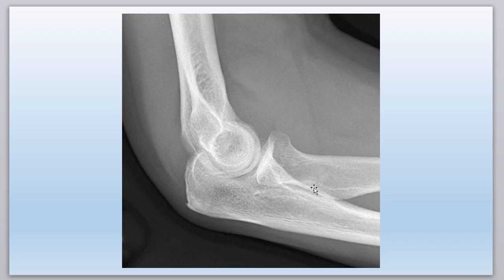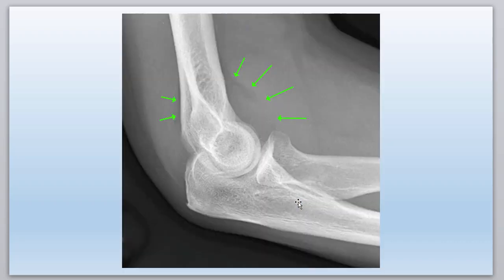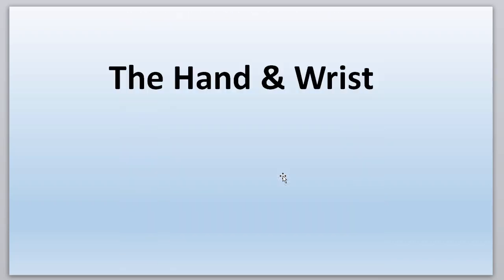They must have had some type of trauma. But my guess is there's a fracture in here somewhere, which we just can't see really that good on here, but something looks funky in here. So, fat pad signs. And by the way, this did turn out to be a fracture, but it needed to be demonstrated on CT. There was a fracture through the neck here, but they had to order a CT on this one.